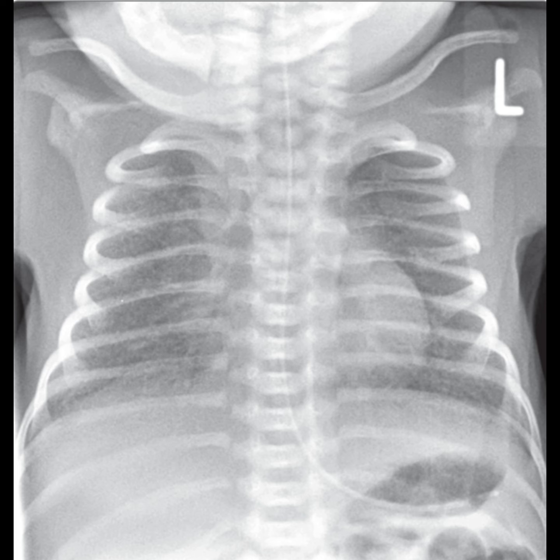For intubated infants, it's crucial to watch for complications, such as pneumothorax or pulmonary interstitial emphysema. So in summary, this case presents typical features of RDS in a premature neonate. However, the differential diagnosis also includes other conditions like TTN and meconium aspiration syndrome, depending on the clinical context and gestational age. As always, thorough clinical correlation is essential to ensure accurate diagnosis and appropriate management.